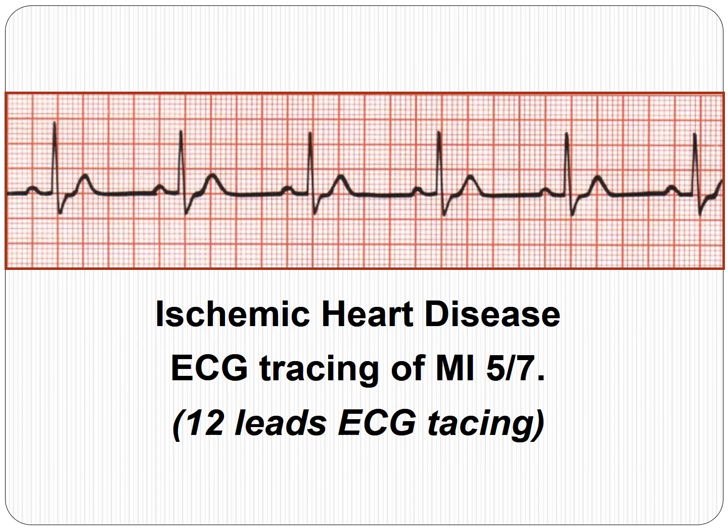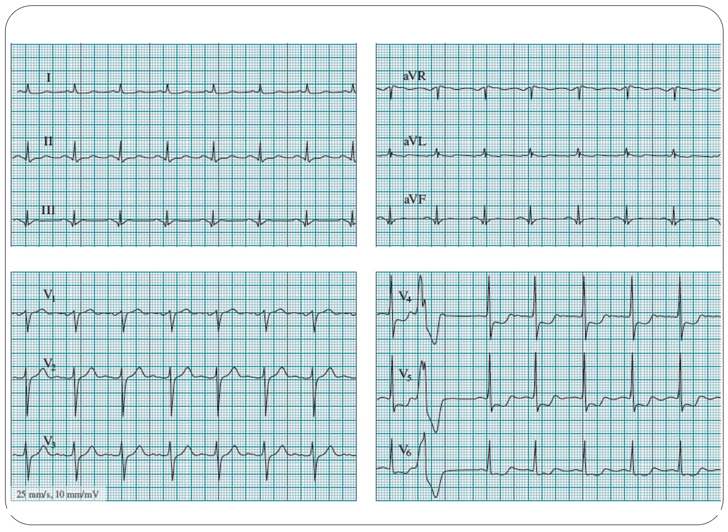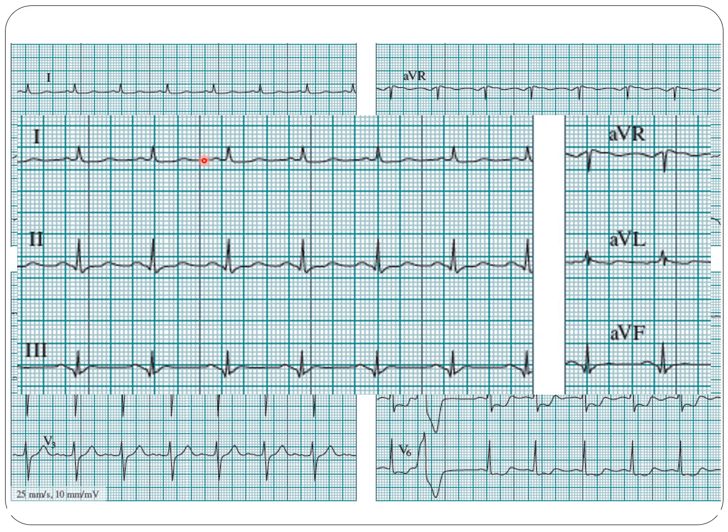In the next session, first of all, you have to look at the rhythmicity. By looking at this tracing, you can see it mostly is rhythmic, except here in V4, V5, and V6. Let's look at first the heart rate.